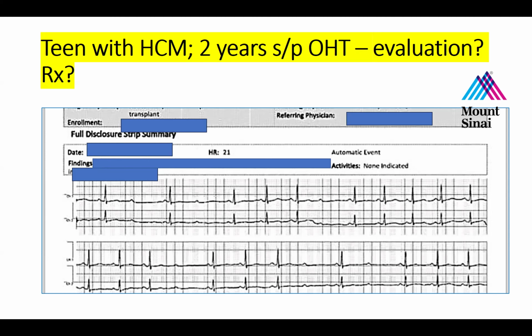You have to remember also that because the heart is denervated in a heart transplant patient, it's not uncommon that they could have ischemia and not feel any discomfort from it. So you can't necessarily take the lack of chest pain symptoms as a sign that they are not having ischemia that could be resulting in this. Now, again, this strip I'm showing you is not the worst strip of all time. But if the patient comes in and has 7-second pauses with higher grade block, that is a concern.